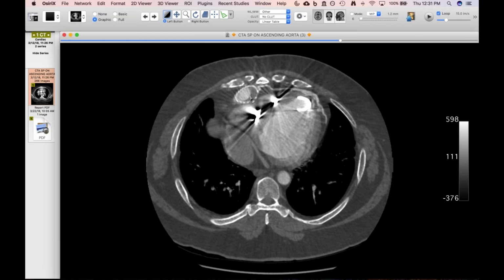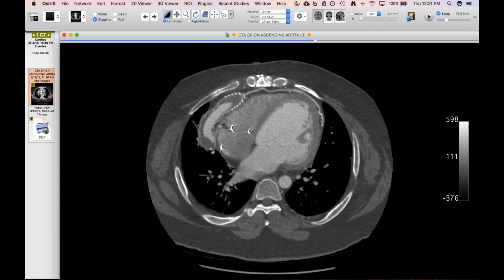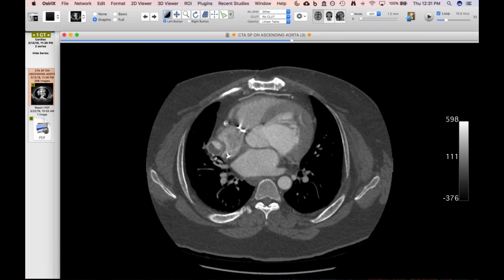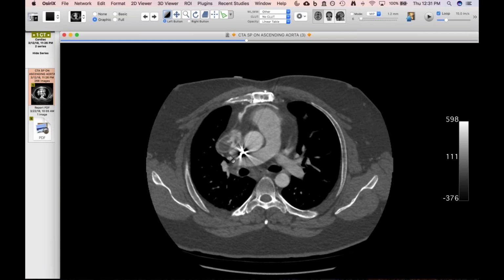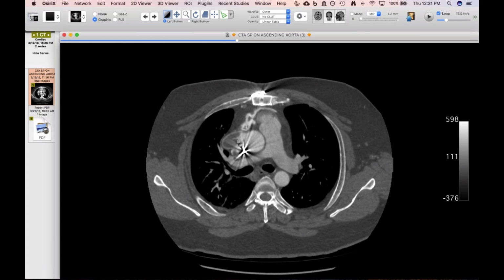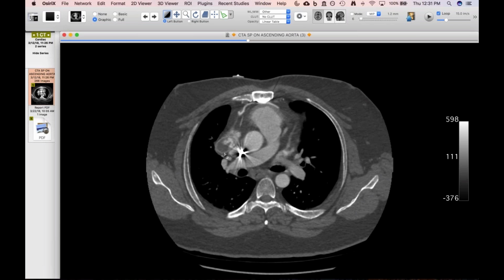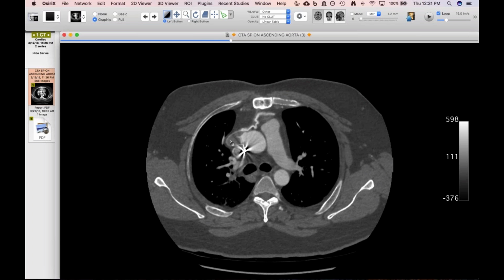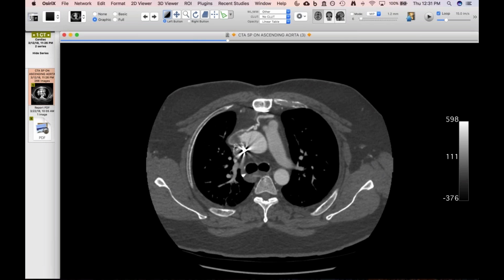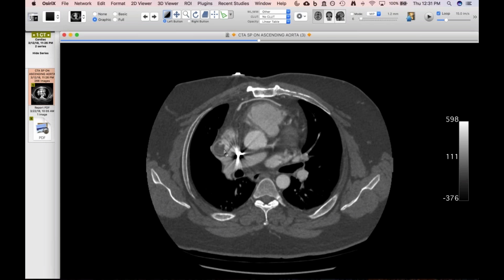Remember, the outflow cannula has basically a tube within a tube, and you can see how there's pretty substantial narrowing. And as you look even higher up, you can see how narrow the contrast channel gets. And so this was obstruction, whether it's thrombus or debris accumulating outside of the inner lumen and within this outer lumen, which is what this looks more characteristic of. Regardless, the patient went for surgery to relieve this. And when they incised this outer graft, this was all just yellow debris and some sort of serous fluid that was in that. So it was not thrombus.